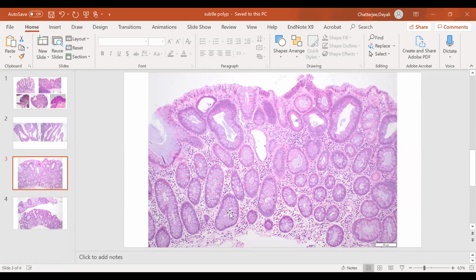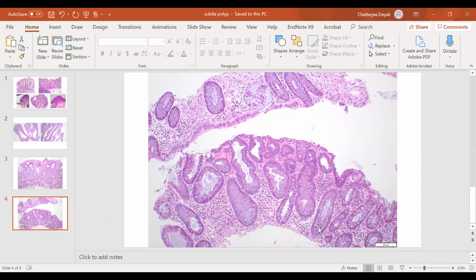In this case, I did look very carefully, as the morphology of this polyp is unusual, and I did try to find other areas of serration like this without dysplasia, and that was not present. So this is an unusual polyp and probably it arose in that background, but essentially all of that lesional tissue shows cytologic dysplasia. So when you see cytologic dysplasia, this is not about orientation, then it would either fall into a conventional tubular adenoma, or it would be cytologic dysplasia in an SSA lesion, but we don't see a non-dysplastic SSA lesion in this case.